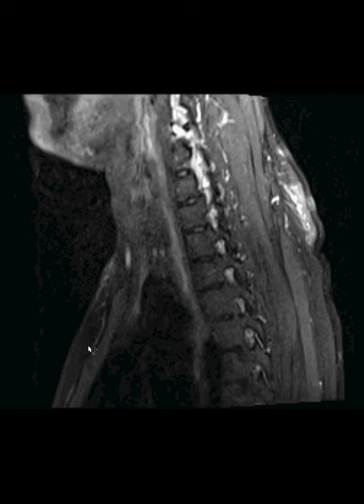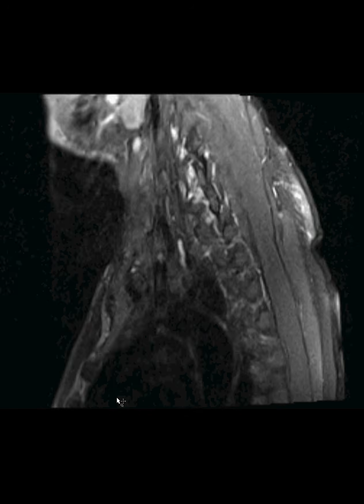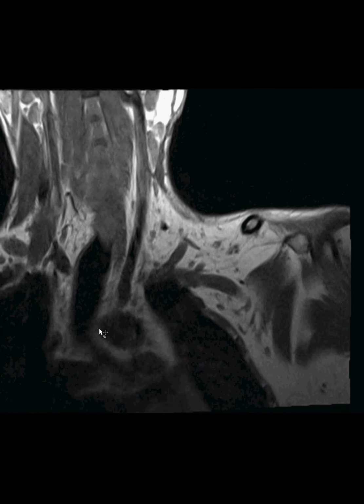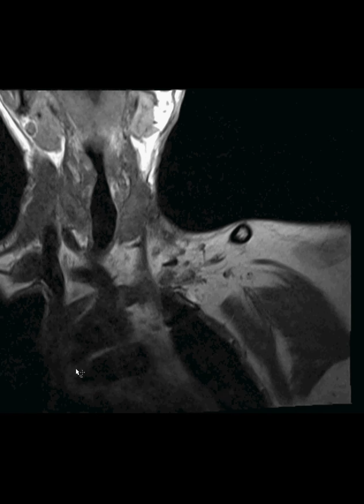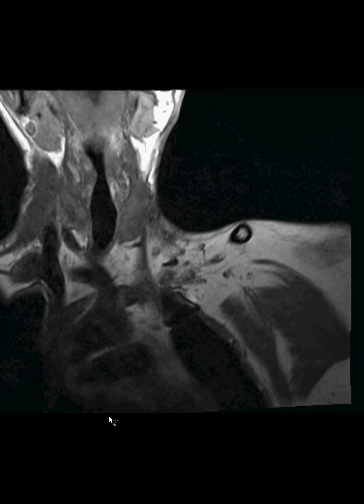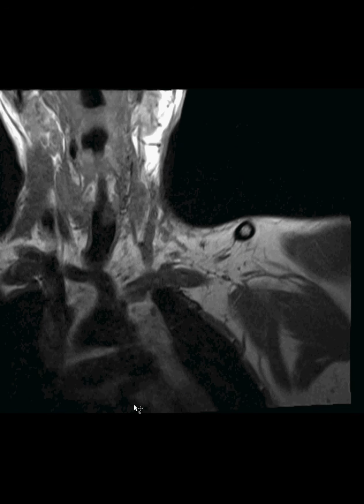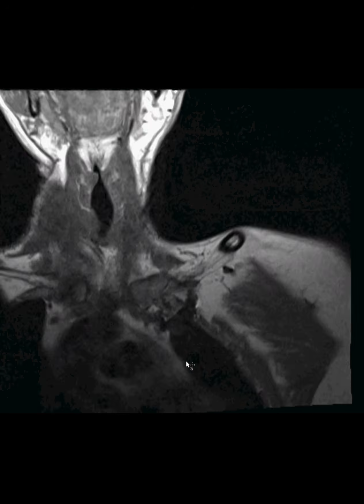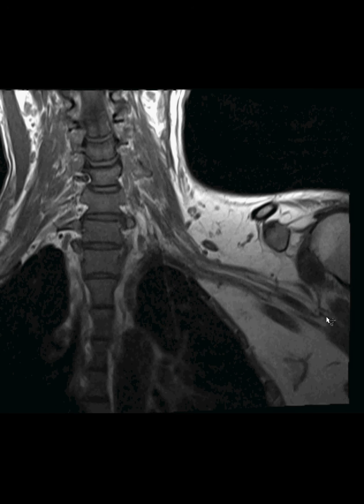When you do these studies, you can put a saturation band on, like the aortic arch, the heart, if it's not already excluded, and maybe someone did put a sat band on the heart, but the arteries here, the aortic arch in particular, can cause problems. And what one can do is put a sat band diagonally like this because it's out of the way of the brachial plexus, right? We're following something here. If you were to make a band go like this, you could exclude all this stuff and maybe prevent the artifact from having a problem.